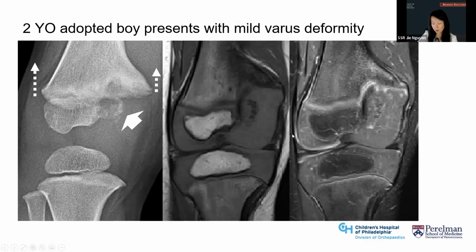And what's really important for this particular case is that the growth plate is still there. You want to be able to identify that growth plate throughout. Make sure you don't see any tethering or any bar, because this one may continue to grow. And what you need is another time point. So now you have one time point. You need another 6-month or 1-year follow-up just to see how much growth there is and calculate the ratio of growth between the sides, to determine how much angulation deformity there is and for them to plan how much rotation they need to plan in for the surgery.